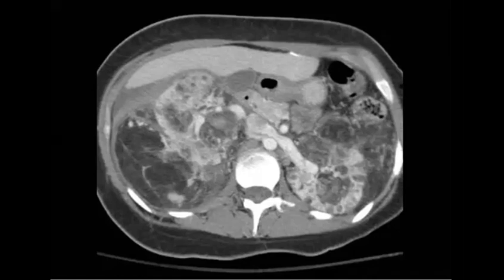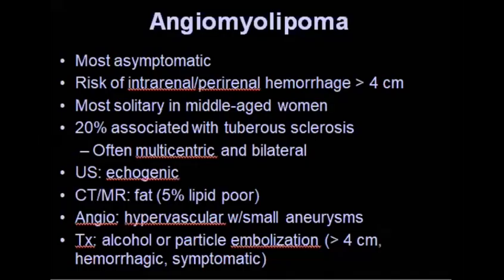a risk for rupture. Okay. Some of this type have lipid-poor content, so you cannot see the fat of the AML. So ruptured AML with perirenal hematoma, this is what is called Wunderlich syndrome. Oh, something good to know. Okay, thank you. So this is what is called angiomyolipoma.